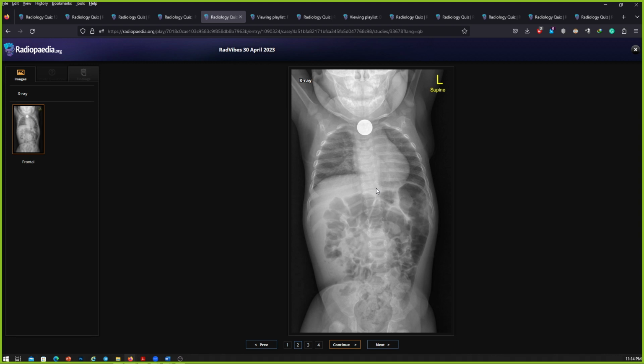Yes, if it is taking an anterior and a coronal orientation, it will be in the esophagus. If it's taking a sagittal orientation where its long diameter is anterior posterior, it should be in the trachea. You said that if it's taking a coronal view, it's likely to be in the esophagus. I want you to complete the sentence. If it is taking a coronal view, on which view? On the frontal view or the lateral? On the frontal view. Okay, you can have a look at the lateral radiograph here.